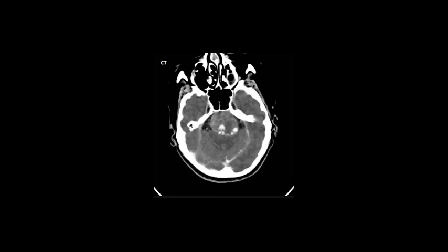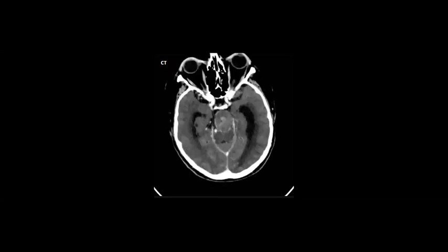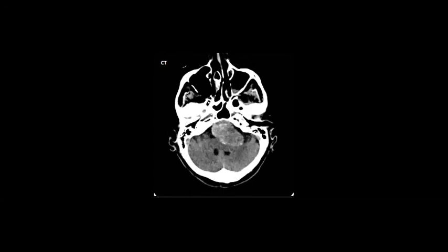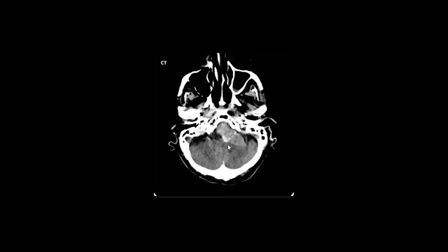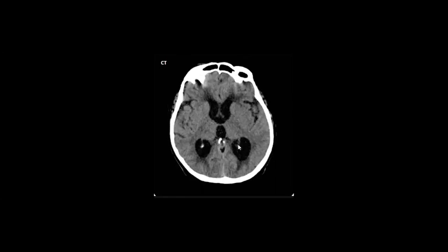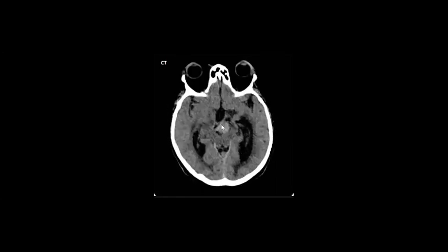So this one, it is an aneurysm. This is the non-contrast image. And you can see there is a mass, heterogeneous attenuation, and there is a compressive effect on the brain and brainstem. And the most important, if you don't mention it, you will lose many marks in the exam, and you lose the patient if it is real life: the hydrocephalus, don't forget it.